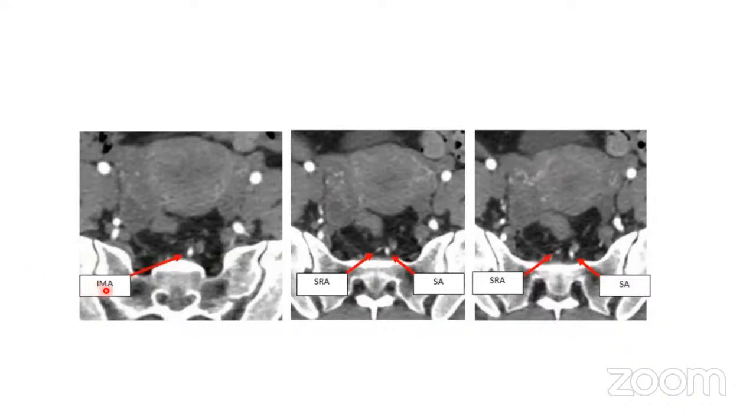What is the superior rectal or the inferior mesenteric and then the sigmoid artery? We know that the inferior mesenteric artery arises from the aorta approximately at the level of the L3 vertebra, a few inches below the superior mesenteric. This is the inferior mesenteric artery. If you follow it up from the aorta, you can see it splitting into two, the superior rectal artery and the sigmoid artery. Here we will ensure that our volume is at least 7 mm anterior to these vessels.